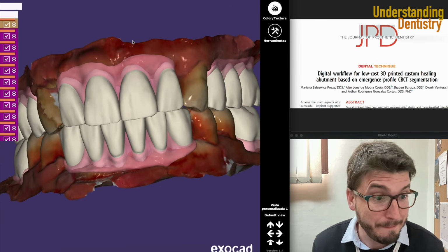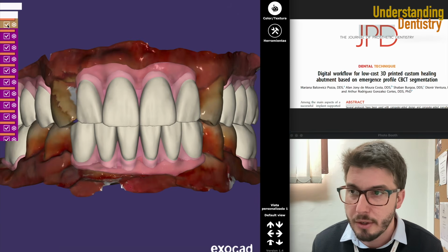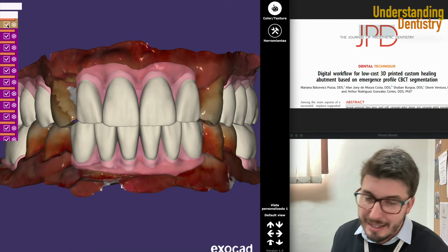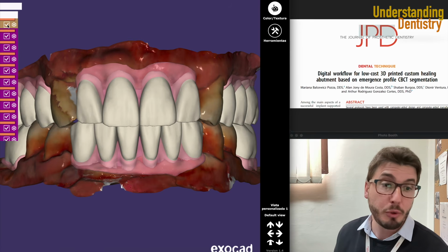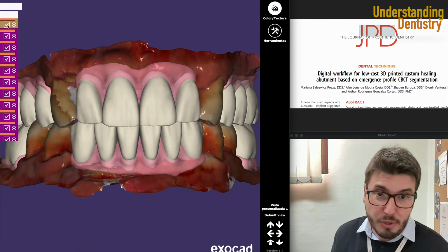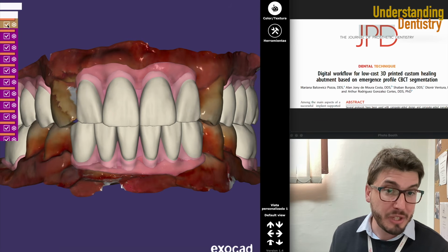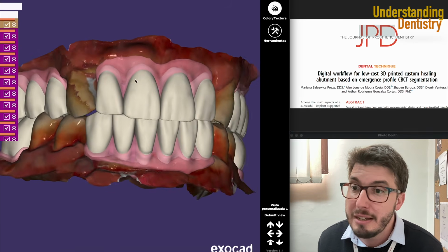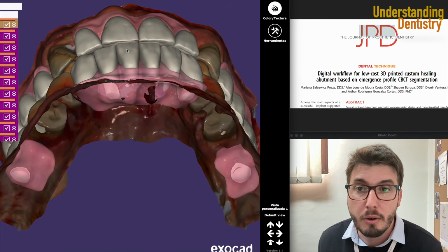very nicely. And then those are the intraoral scans, of course. So your nice intraoral scans or the cast of the patient. Here, I believe it's actually the impression of the patient leading to a conventional dental cast, so a gypsum dental cast, which was scanned with a desktop scanner. So you can also use your desktop scanner if you don't have an intraoral scan.